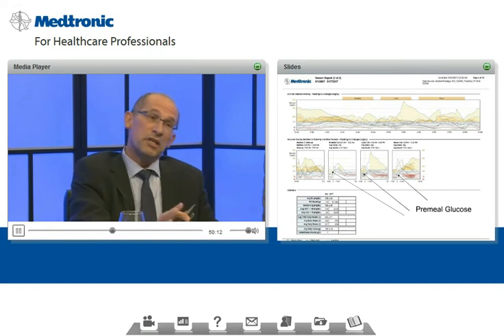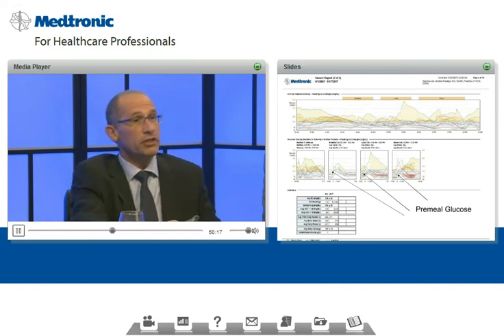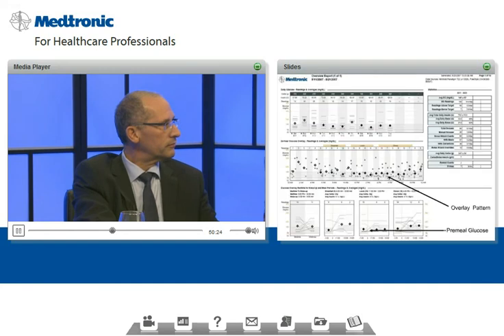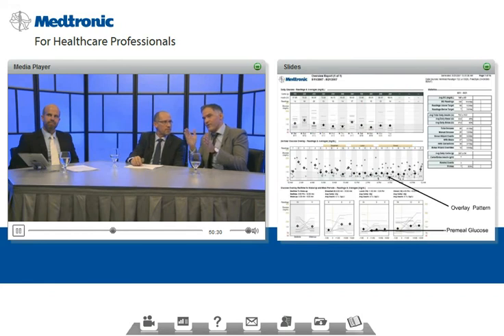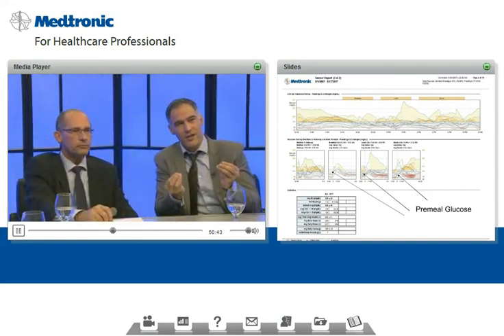So again, it hints to the issue that during the night the basal rate is too low, but during the day probably the basal rate is fine and fitting. Wouldn't it be nice if a bolus lasts for 3 to 5 hours, let's say 4 hours on average, if you could hit a button, it would only show the sensor lines when bolus is not active, and then you would have an idea of basal assessment.